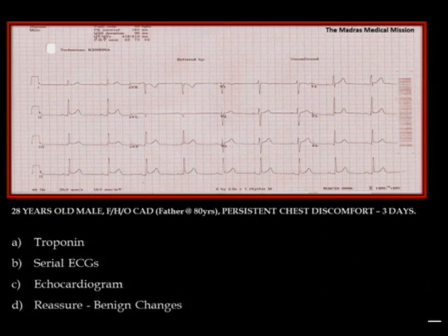And now coming back to the ECG per se. Well, there is a tendency for an ST segment to be elevated, but we are all taught by the ECG criteria people that it is not just the elevation, it has to be significantly more in the anterior precordial leads, and it should not be less than 2 millimeter and consistently in at least 2 contiguous leads.